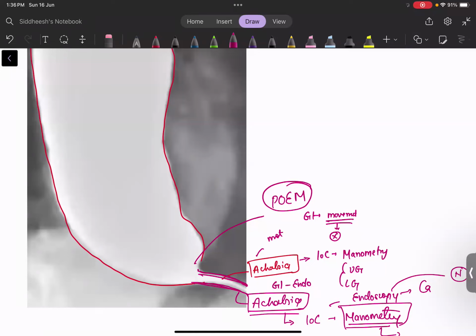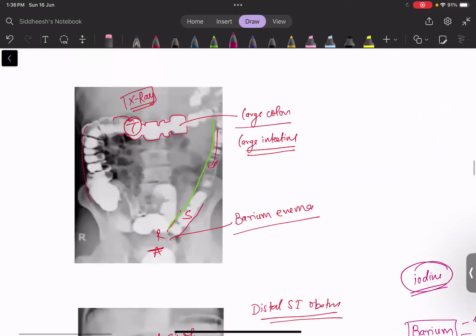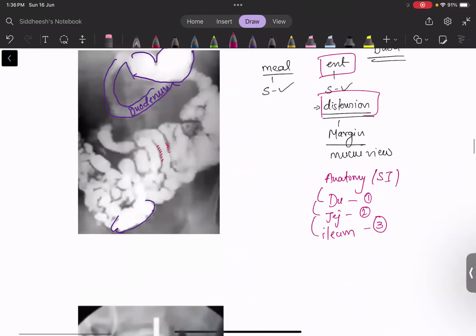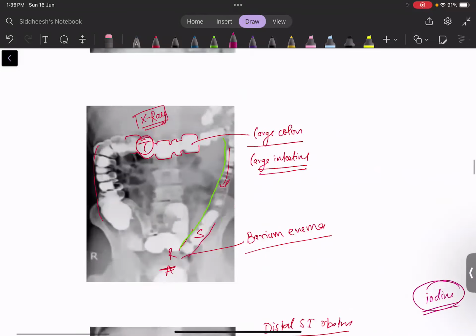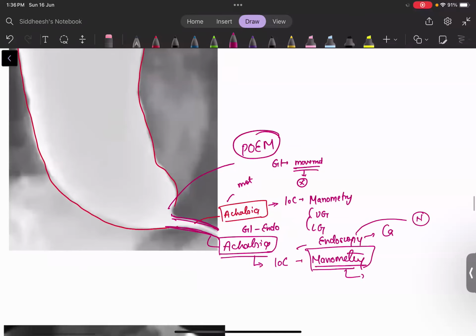Is it swelling? No, this is barium. See, this is the X-ray. Something is shining. Compare with the last images we have learned. See, shining, shining, shining. Again shining. This is the barium that we are giving. Okay, done everyone? So this part is done.